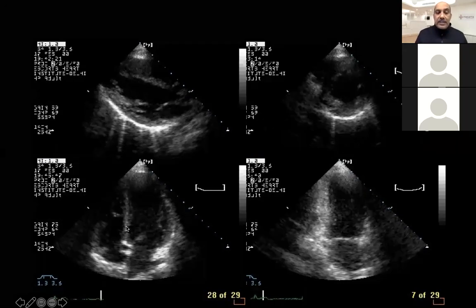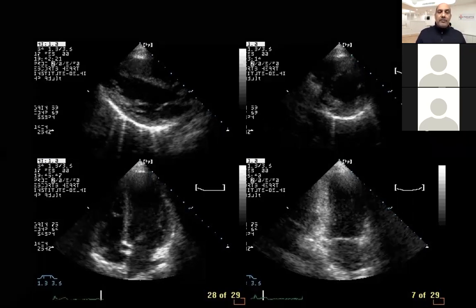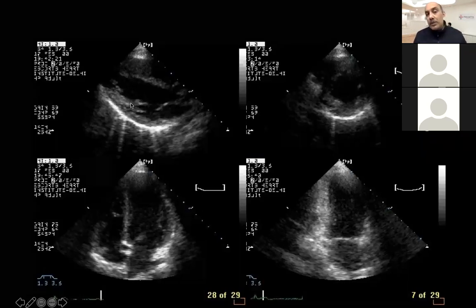But there is where the error is. You have to look at the landmarks. We did discuss that the papillary muscle does not originate from the posterior segment. It originates from the inferior wall. And very commonly, when we are doing an echocardiogram in systole, sometimes throughout the cardiac cycle, we look at the origin of papillary muscle, where this is inferior wall, not the posterior wall.